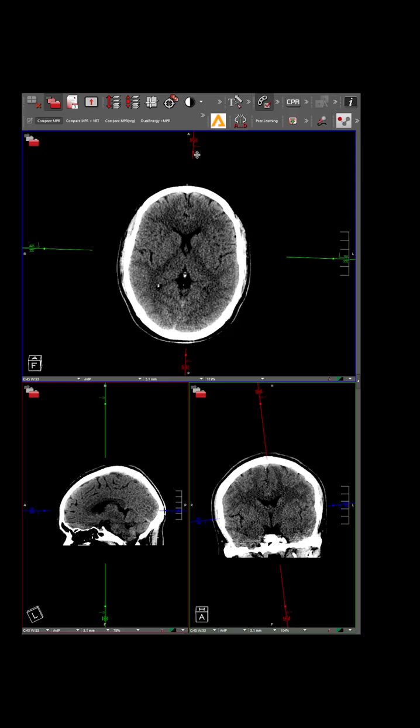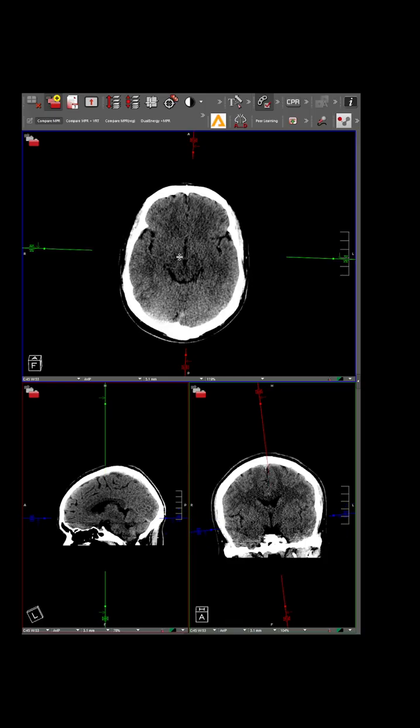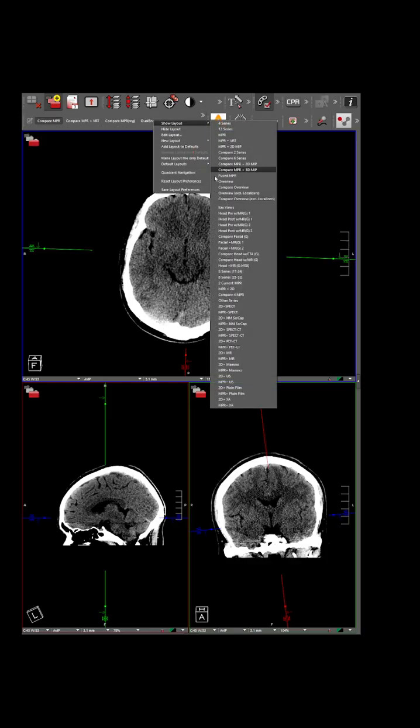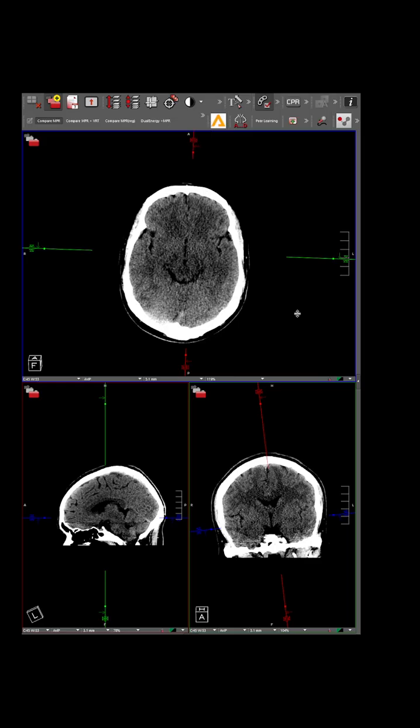One other subtlety I'll add is, sometimes if you're opening a radiograph and you want to compare it to a prior CT, the hanging protocol does not necessarily allow you to pull things into an MPR viewer, among the default protocols. So you have to search through here, or either search through here or search through here for something that has an MPR, and that can be a way to bring that up.